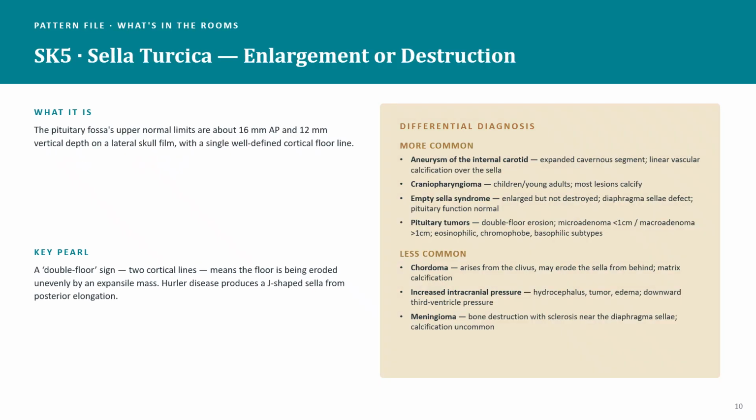All right, now we're moving on to Sella-Turcica signs or changes, Sella-Turcica patterns. Again, the Sella-Turcica is the area of the skull that holds our pituitary gland. Normally, the Sella-Turcica is typically smooth, and it's a very well-defined area on our x-ray images. If it becomes enlarged or starts to look damaged, what they'll start looking for is what we call a double floor sign.